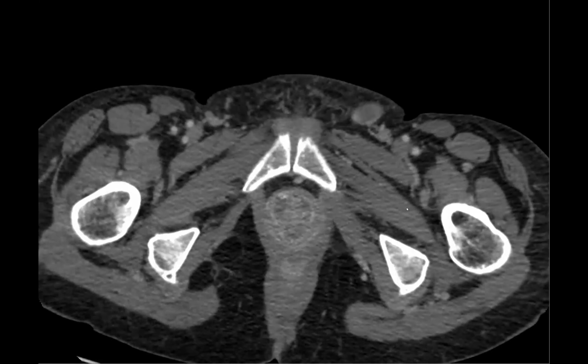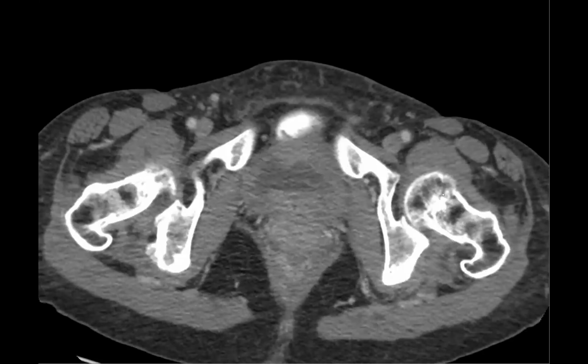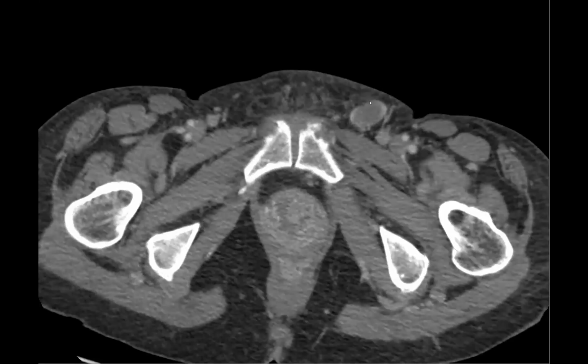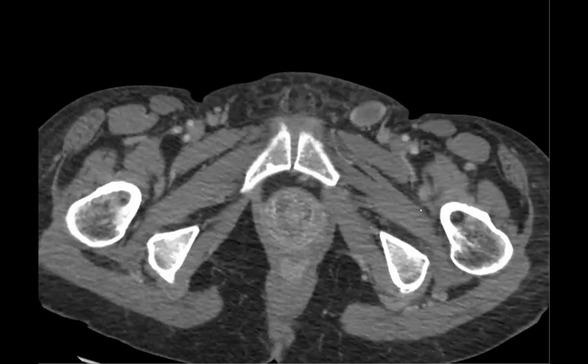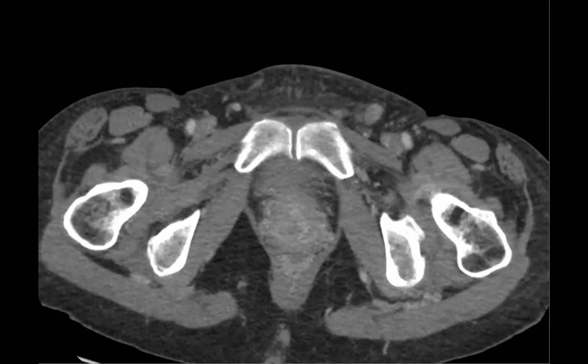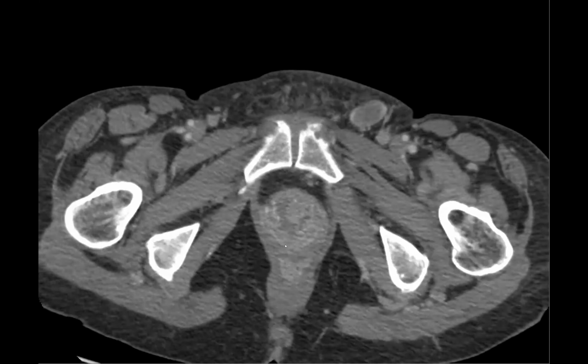You guys still there? Yeah. Round. There's a lymph node in the left inguinal region. There's a round... There's ligament thickening inside? No, it looks like a lymph node. It looks like some kind of cancer. But anyways, the vagina, is it the vagina? It looks really thickened, super thickened. Okay. Do you have the sagittal? Yeah, but I will tell you, it's not the vagina.